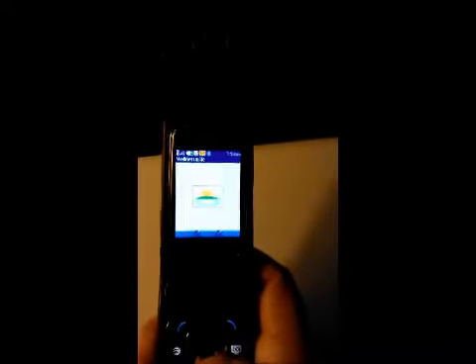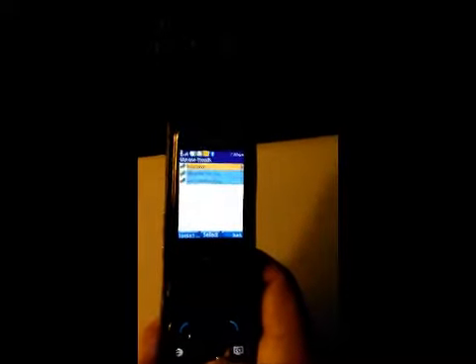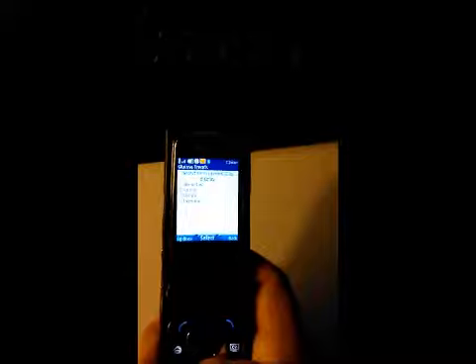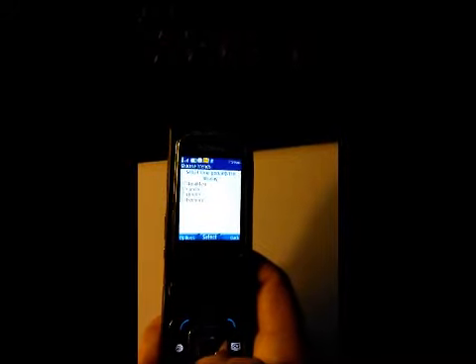I can look at the trends on this as well over the last, let's say, 30 days. So I'll just press that. It'll gather the data back, and I'm going to look at the glucose trends over the last, let's say, 30 days. And I can do it for breakfast, lunch, dinner. It doesn't really matter. I'm going to go back right here, and I'm going to do it for, let's say, breakfast. Let's see what my trends look like for breakfast.